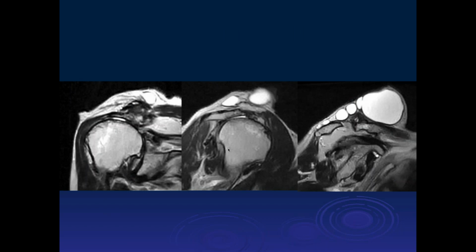Okay, Thomas, what do you think of this case? So there was lobulated septated cystic collections superior to the acromioclavicular joint, and there's osteoarthritic changes of the glenohumeral joint. Yeah, complete rotator cuff tear, superior migration of the humeral head, which we'll talk about. The humeral head is way up here. It should be articulating with the glenoid here. And the main thing I wanted to point out here was, what about this big cyst?